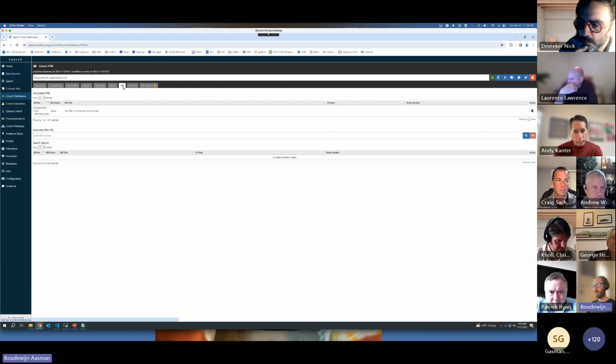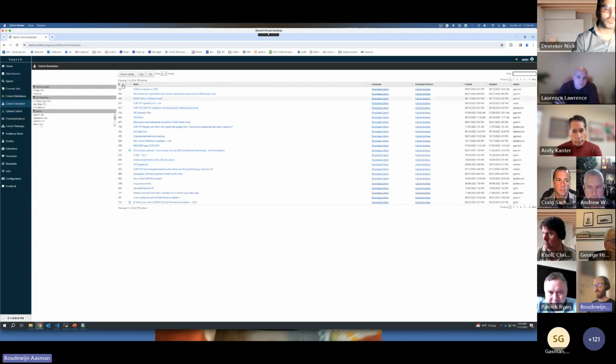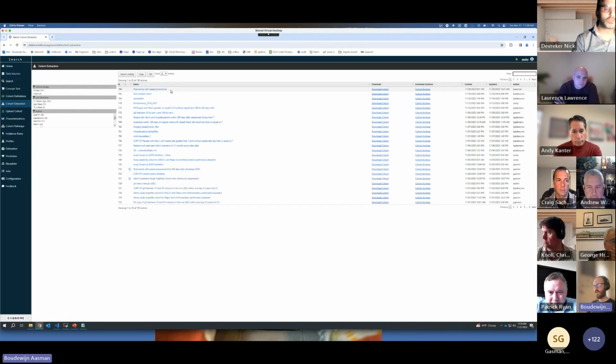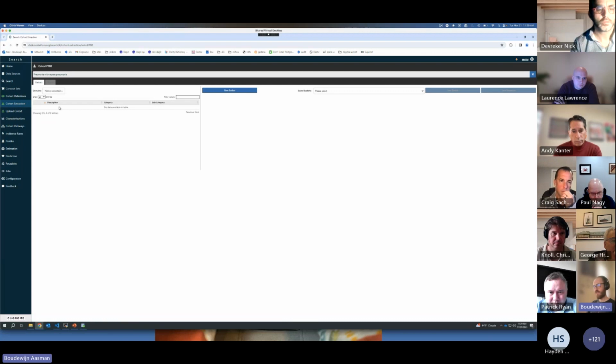We have a separate tab for IRB where they can specify their IRB that allows them to see patient level information. In this case, I'm using a test exempt IRB that's only available to a couple select super users, but this is going to allow me to extract patient level information. So now I'm going to the cohort extraction and find this cohort and click on download cohort. And that brings up the UI from the snapshot that we were just looking at.